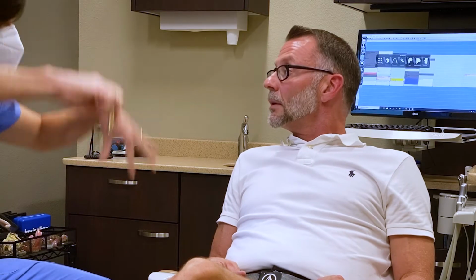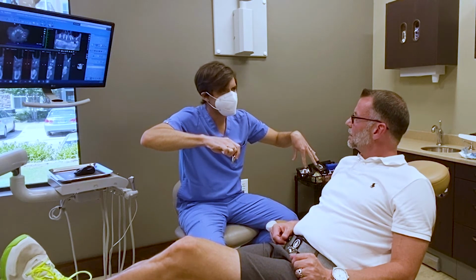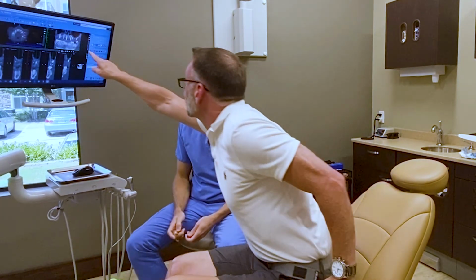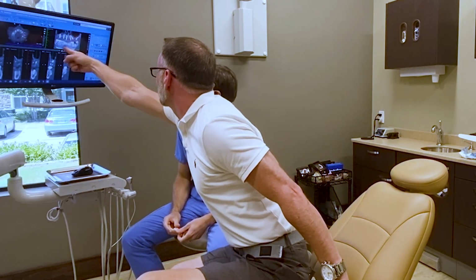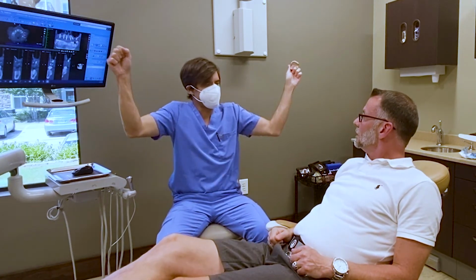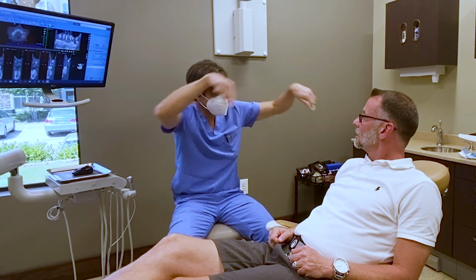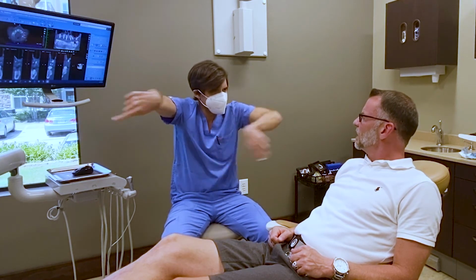But imagine you have this like this. How do you engage? You cannot get in. Right. If you have 10 degrees, look at how far off that is versus that. Yes, so you cannot get in. Imagine you have to get into the connection. Imagine a male going into a female. Okay, with the male it's impossible.